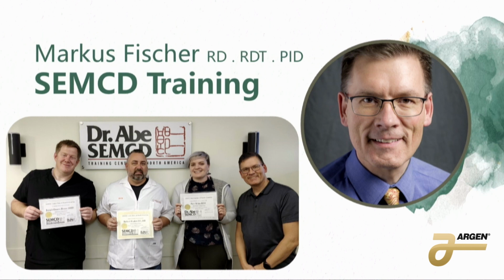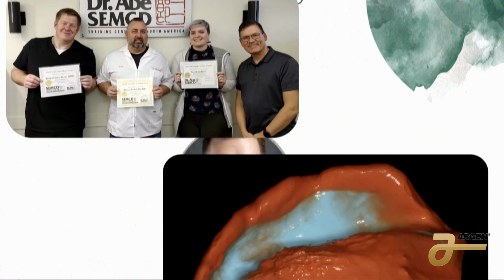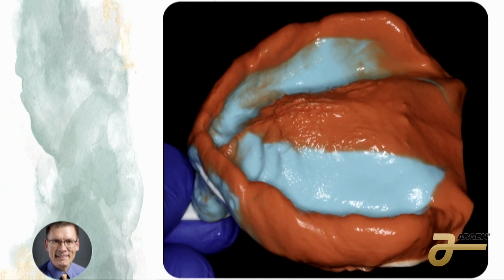So I took this course last year. My mind was blown. I did know a lot about impressions, but his quality of work is just out of this world. So he gave me some of his photos that I can use today. So this here is Marcus's preliminary impression. This is a prelim. And I know some of you in the laboratory are thinking, this is nicer than the finals that I get. So this is a preliminary impression. And you can see that this is an alginate impression, and he does it in 2 steps.